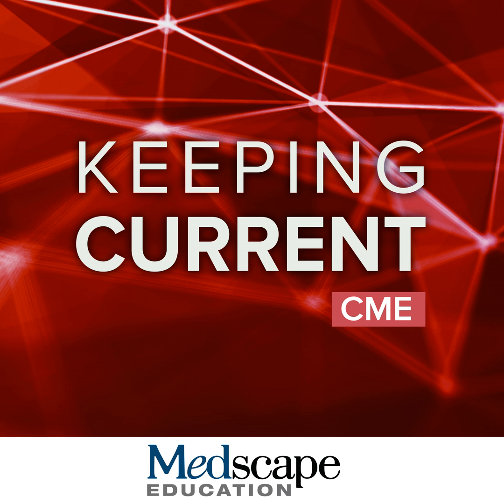There are, however, many newer techniques which can be integrated into the basic protocol, and they are shown here. We do have a more rapid cine imaging technique available using compressed sensing, just a term used for accelerated cine MRI of the heart, and I'll show you how that's integrated into clinical practice. We can look at regional function using tissue phase mapping, or various techniques for looking at function at the segmental level. We can do mapping techniques to look at scar or edema at the microcellular level, and all of these are typically combined together to really enhance characterization of disease when you're running your CMR protocol.